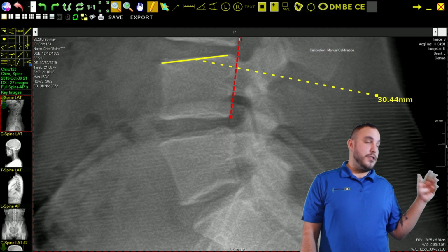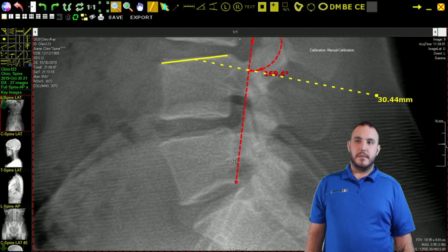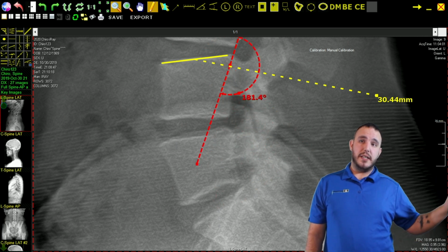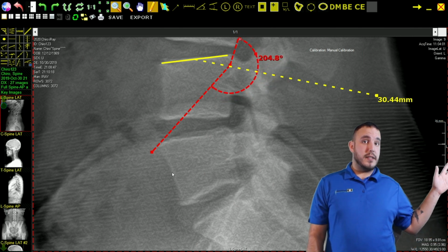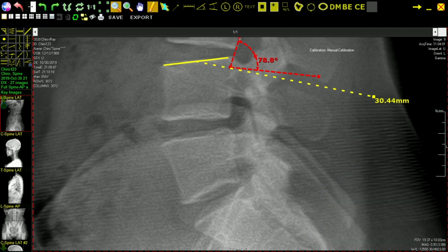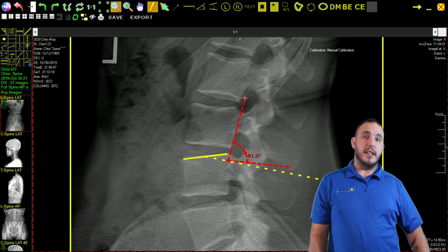So this allows you to zoom in on the annotation to make sure you lined it up exactly where you want. As you can see here, if it is squared, you are able to select that to move that joint. If it is the arrowed cross, then that is going to move the entire annotation. To delete the annotations, all you do is select it and hit delete on the keyboard.